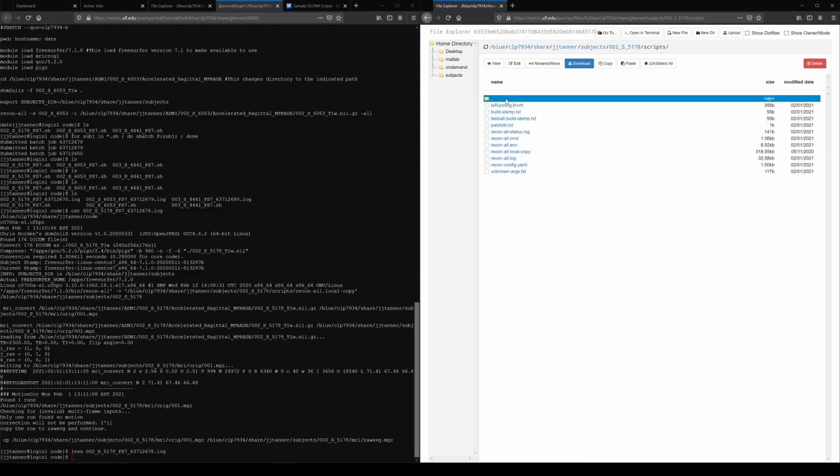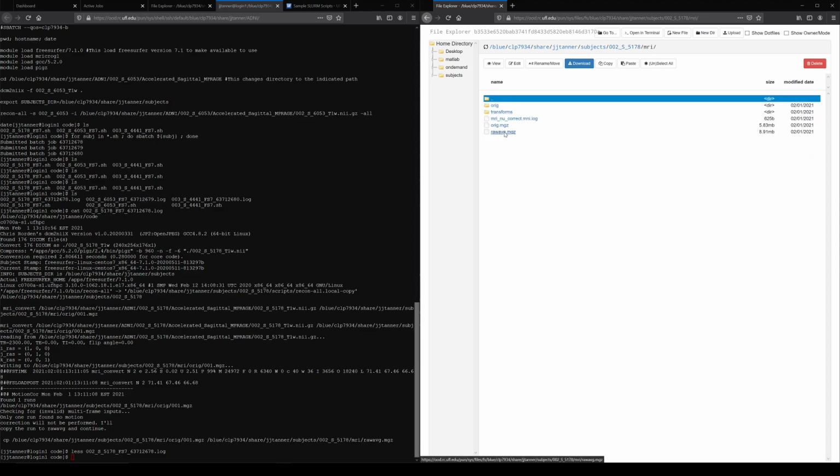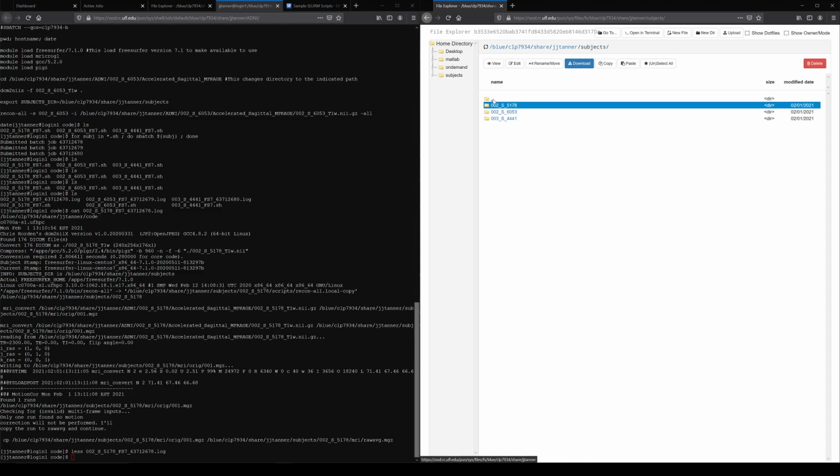and scripts is running. We'll go over the organization of FreeSurfer directories a little bit later, but it's running. There's the log that is saved, so everything that FreeSurfer does is saved to log, and MRI files are created, and more files will show up in here over time because this is still early in the processing.